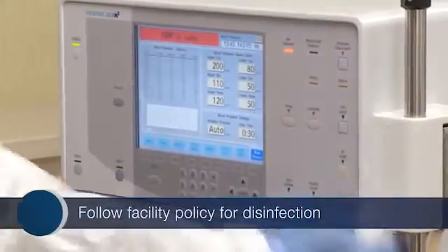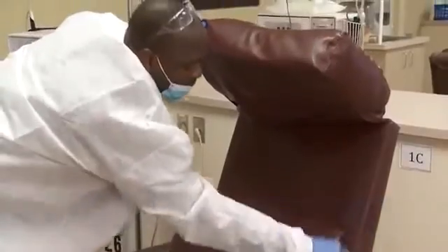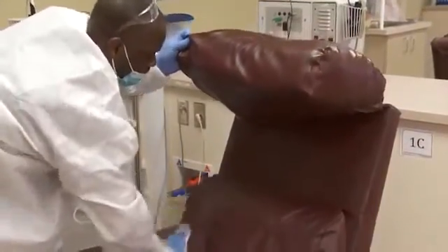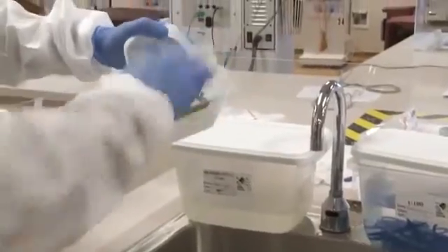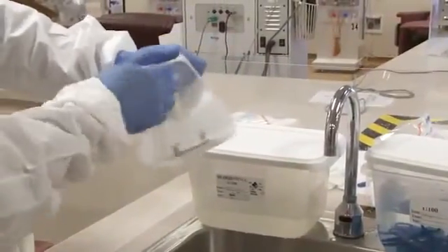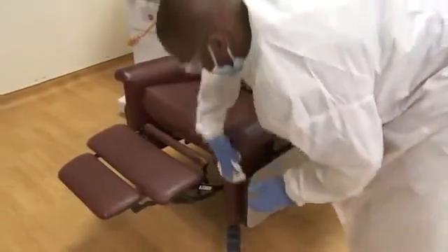Now here are the steps for routine disinfection of the empty dialysis station when there is no visible soil or blood on surfaces. While wearing a gown, put on clean gloves. Apply disinfectant to all surfaces in the dialysis station using a firm wiping motion. Make sure that surfaces of the station are visibly wet with disinfectant. Also, disinfect all surfaces of the emptied priming bucket. Let all surfaces air dry naturally.